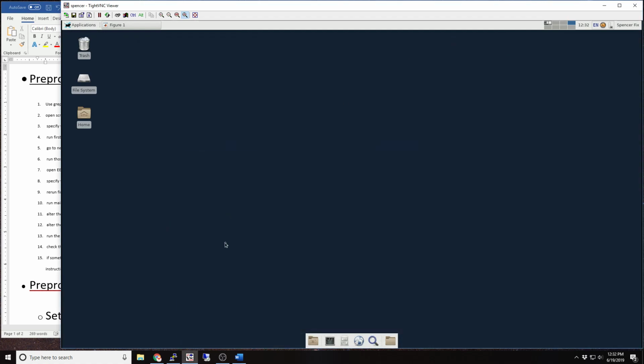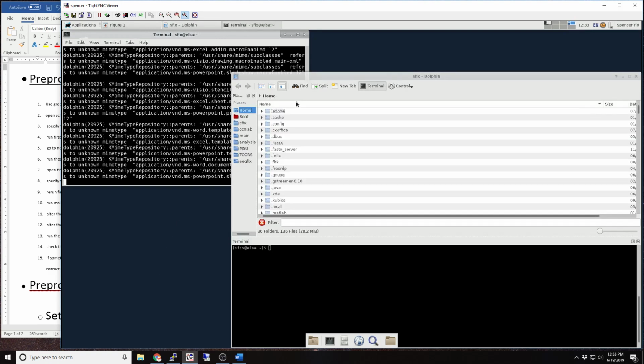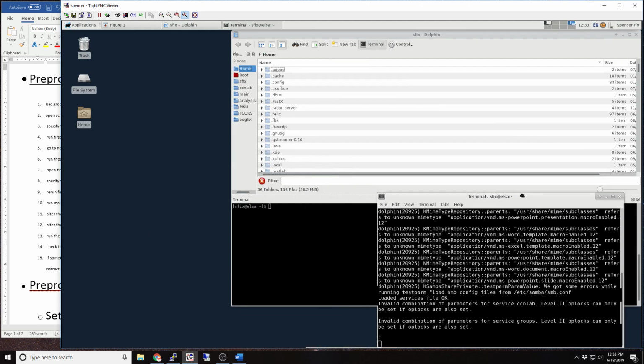Welcome. This is a tutorial on how to pre-process EEG data with the eegfix pre-processing pipeline. I've opened up a terminal window, and first I'm going to open a Dolphin browser, which I use for file browsing.